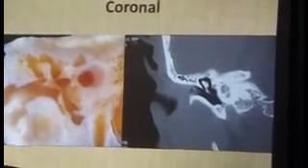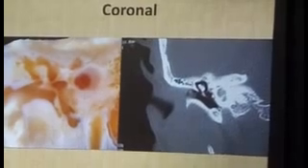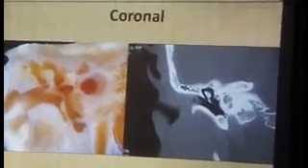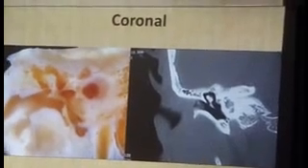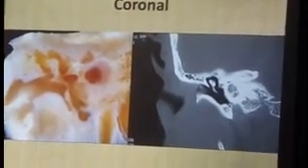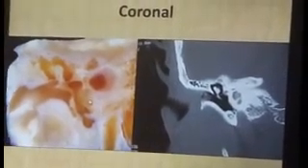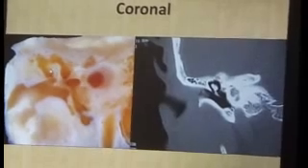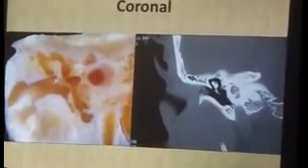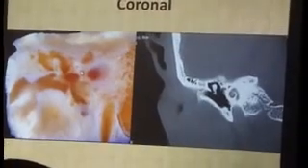Anyway, this is where your cochleariform process with the tensor tympani muscle is. This is your tympanic segment of the facial nerve. This is the labyrinthine segment of the facial nerve, and these are the basal turns of the cochlea. Why am I paying attention to this? Because of what I'm going to show you in the next segment. Similarly, head of malleus, body of incus, incudomalleolar joint, lateral process of malleus, pars flaccida, tensor tympani, and we have the facial nerve over here.